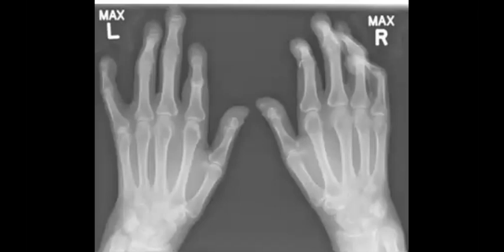Neuropathies, diabetes, as you mentioned, and hyperparathyroidism. The subperiosteal resorption, especially in the radial aspect of the middle phalanges. But you will search for brown tumors, osteosclerosis, any calcification, the same.